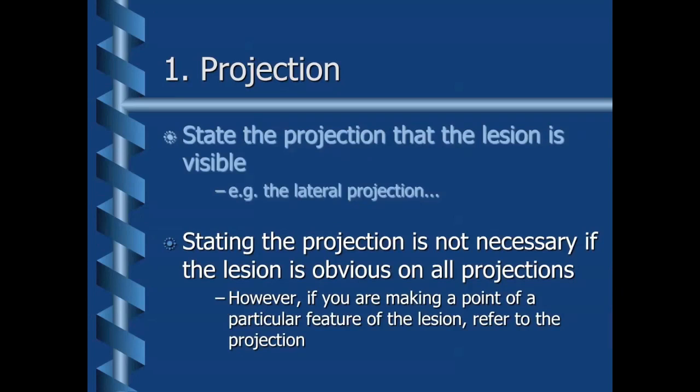Stating the projection is not necessary if the lesion is obvious on all projections. However, if you're making a point of a particular feature of the lesion, then you should refer to the projection that you can see that particular feature in. Okay, so we obviously need to state the projection or projections that the lesion is seen in.